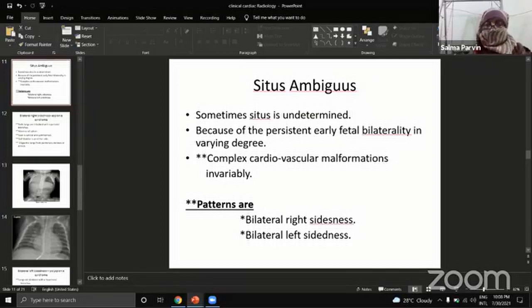You know, the right lung has 3 lobes produced by short and long fissures. Long fissures are present in both lung fields, but the short fissure is only present in the right lung. In a substantial number of cases, the horizontal fissure is seen in the chest X-ray PA view.